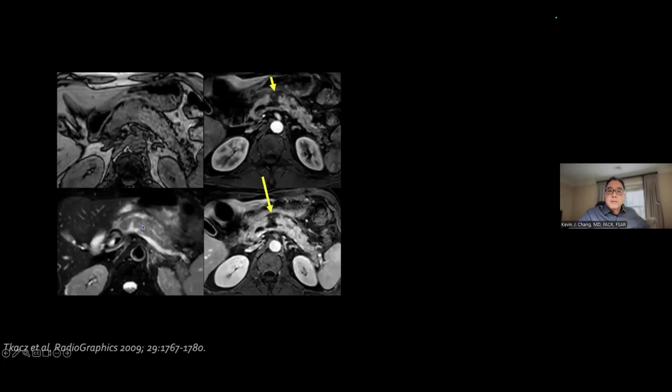And when that laceration that you see on MRI extends to involve at least 50% of the thickness of the pancreatic parenchyma, there's a very high association with a duct laceration. So the main finding is a laceration that's deeper than 50% of the thickness. And then you'll oftentimes see the peripancreatic fluid as well, which may be related to pancreatic leaks.